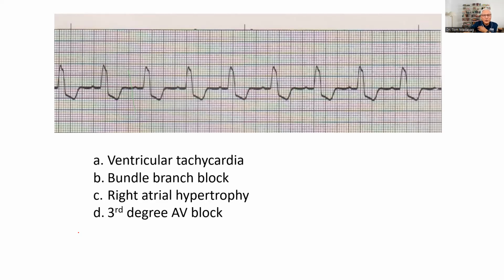Okay, so a lot of you responded as letter B, which is a bundle branch block. That's the correct answer. This is not ventricular tachycardia.